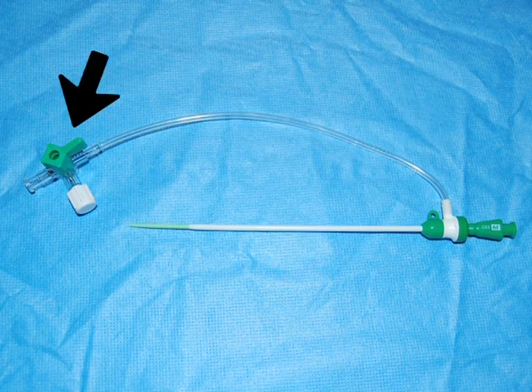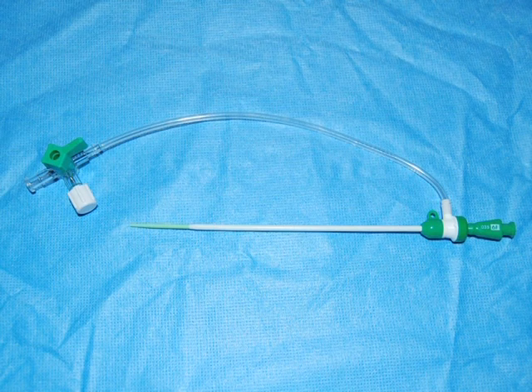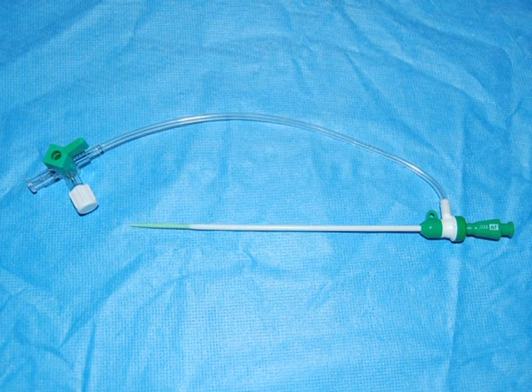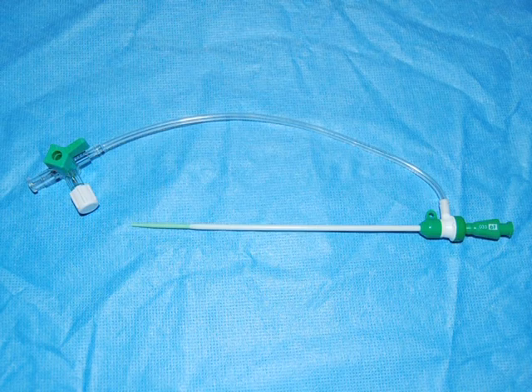the sheath, and it has a stopcock at the end of it to control bleeding or permit introduction of medications. These sheaths are flexible and strong, but they can be kinked if they are flexed to too great a degree, and they are generally coated for easy entry and safety.